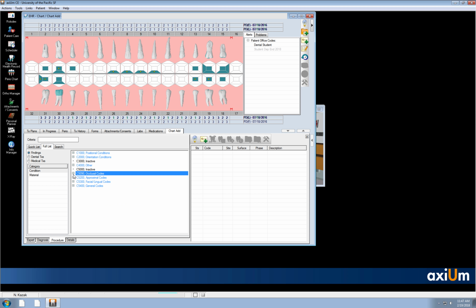With your interproximal codes, you would click approximal codes. And here it divides into E1 to E's and D's. So you would put in exactly what you see on the x-ray. So just a friendly reminder, if it's touching the DEJ, so where the enamel meets the dentin, you want to go into the D1, D2, D3 codes, which are very common things that you would treat with composite or amalgam or whatever. Versus if it hasn't touched the DEJ, you want to kind of stick to E1, E2, and maybe you can treat it chemically.